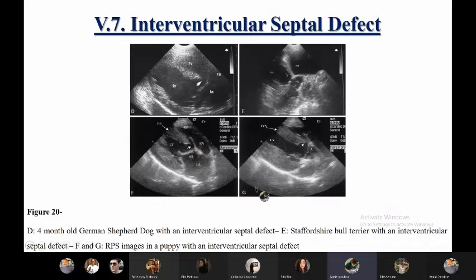ventricle. And G is also another visualization from the same puppy, and this is actually a section of the aortic outflow tract, so the aorta showing from the left ventricle here. And this is not obvious, so the septal defect is not obvious in this sectioning, but it could also be quantified in G and using color flow Doppler image observed more easily than in F.